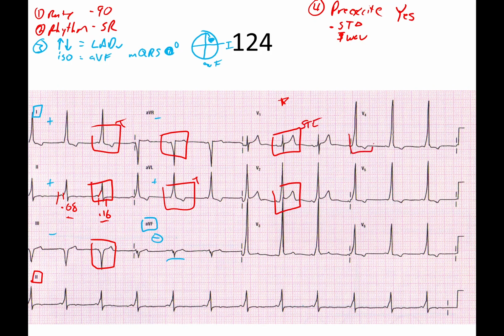And you can see there's the T wave on this one. I'm going to scoot over a little bit. T wave is inverted. And what this is known as is a pseudo-infarct. And it's saying that this patient has a reentrant rhythm so that those T wave and ST changes may actually be due to that reentrant rhythm, not necessarily an ischemic event.